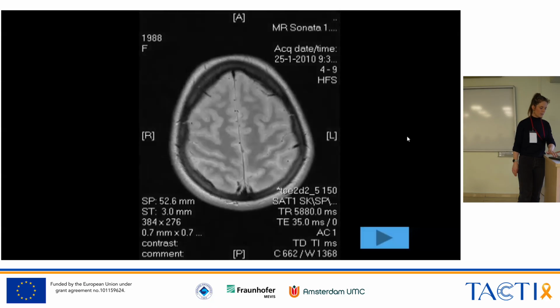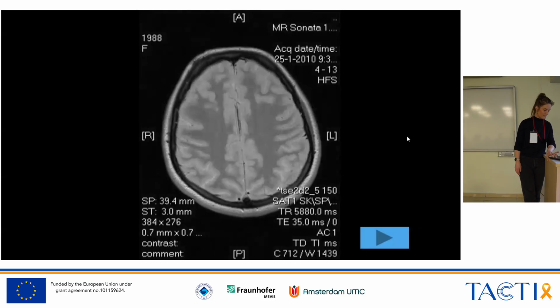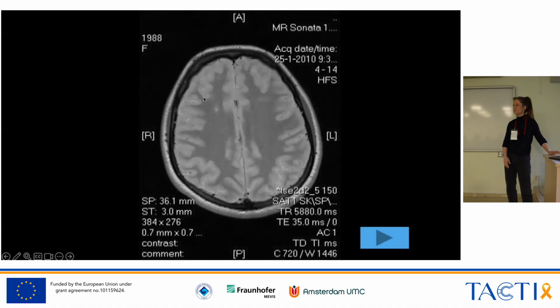And can you remember where the problems were? Just shout if you see. Yeah. So this was the problem here. What do you think if you see this lesion? Do you find it a typical lesion, or do you find that it's still dubious if this is demyelination? Dubious? Yeah, for sure. Do you know why? Yeah, it's only one. Yeah, you would hope to see more.